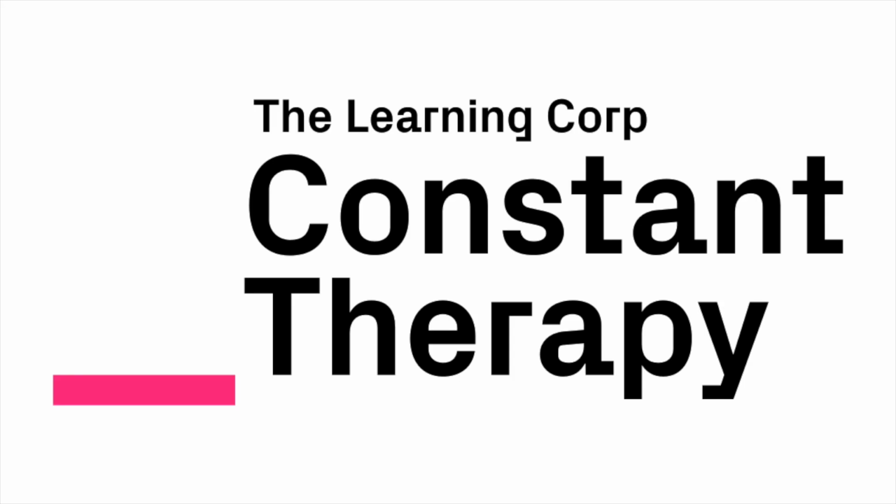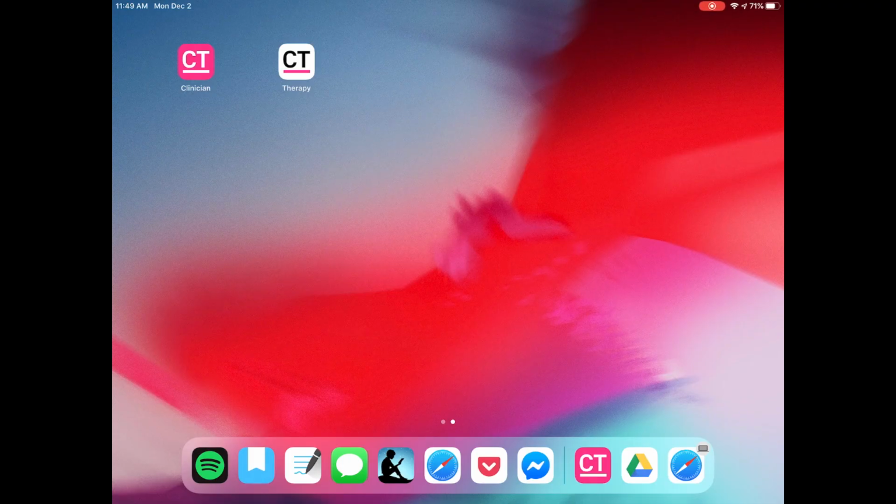This video will give an overview of everything clinicians need to know to get up and running with Constant Therapy. Let's take a tour around your Constant Therapy Clinician app.